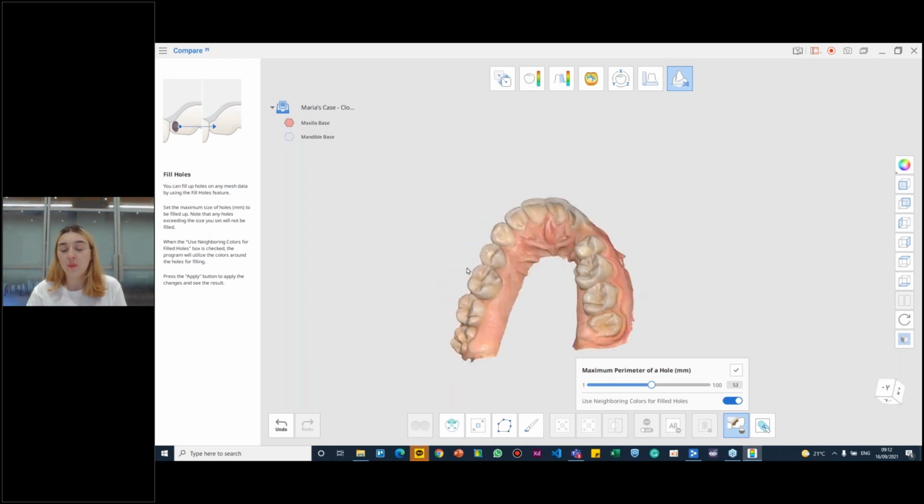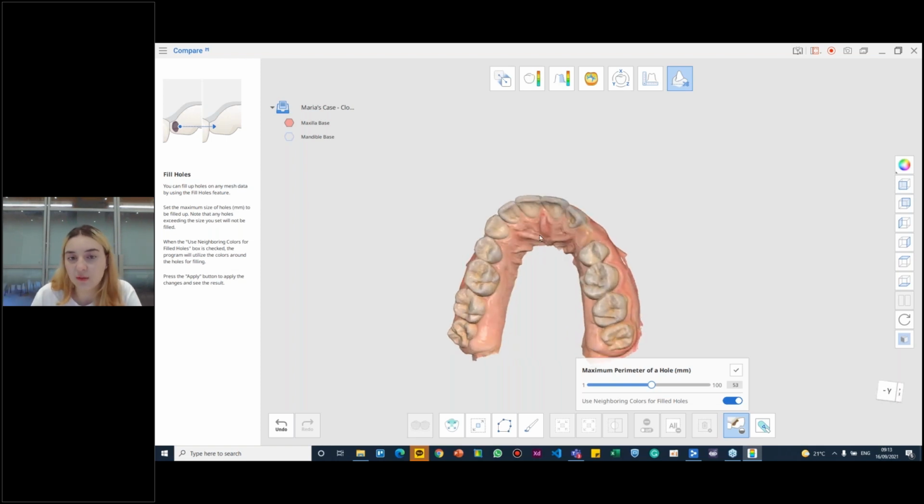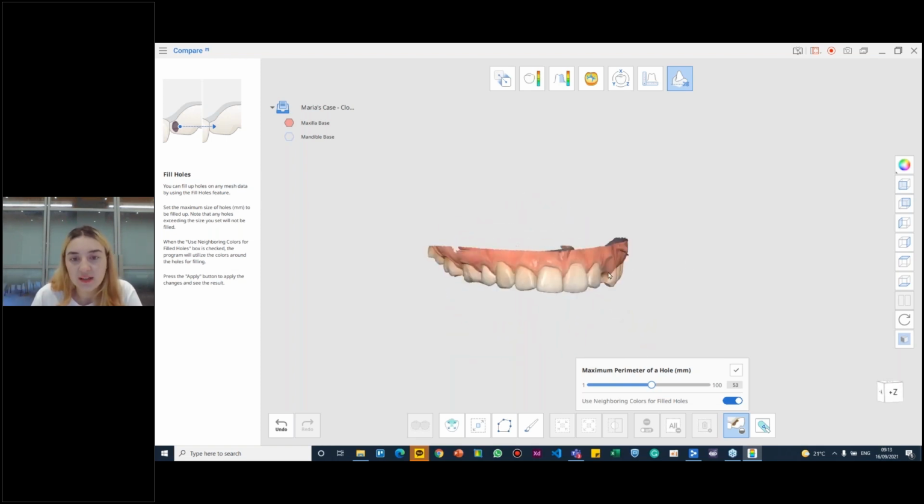And we just released a new hotfix for Model Builder, which will allow you to import not just scanned data, but also the data that you attach to Medit Link from Medit Compare. This hotfix is made specifically for situations where you want to create a model for Model Builder, but you need to edit it first, like sculpt it a little bit more. So you will see that the overall process is so much easier right now. And yeah, here we are.